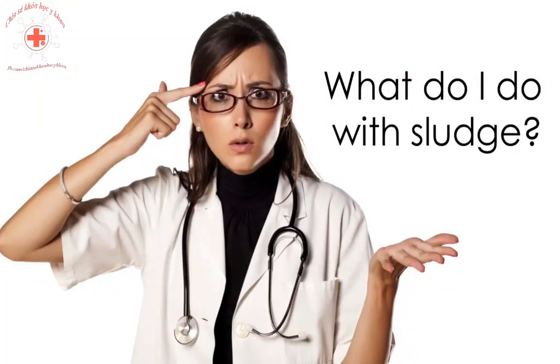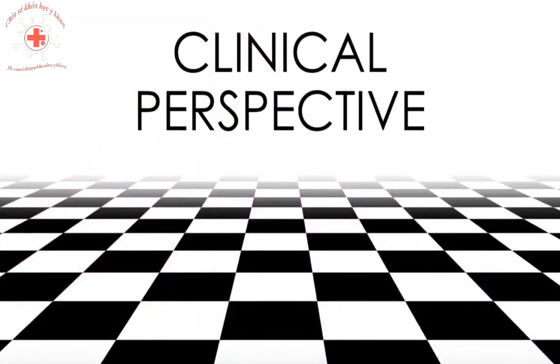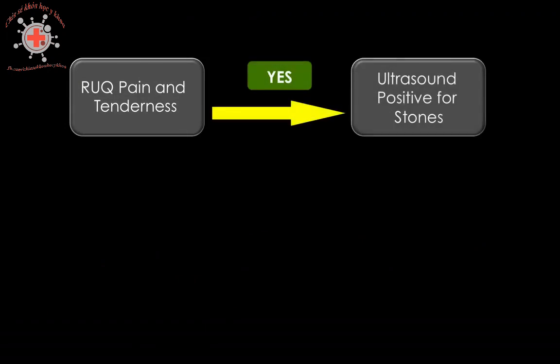So what should the clinician do with gallbladder sludge? It depends on whether or not the patient is having symptoms or findings associated with cholecystitis. If asymptomatic, just watch. Let's take the information we have reviewed and put it into a clinical strategy for taking care of your patients. If a patient presents with the signs and symptoms of biliary disease, then an ultrasound should be performed to look for evidence of stones.